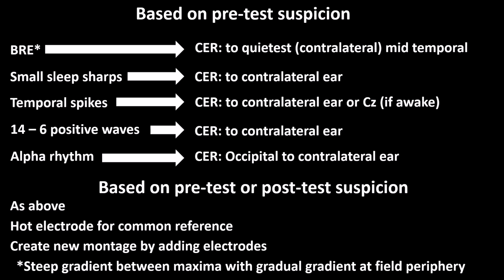This method will usually get you to the right conclusion regarding the localization and extent of an electrical field produced by a vertical dipole. But at times, as you may have concluded, when a definite single field cannot be drawn, it may be that you are dealing with a horizontal dipole, or you may be dealing with an artifact.